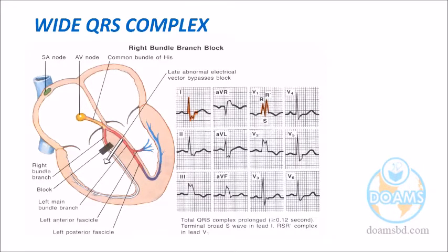If ST elevation is up in the anterior surface, in the posterior surface the ST segment will be down, like a mirror. So the same thing is happening here. If the right side is M, then the QRS in the opposite side, not always, it is not mandatory. You see in lead 1, the left-sided lead shows the W. Very characteristic for right bundle branch block.